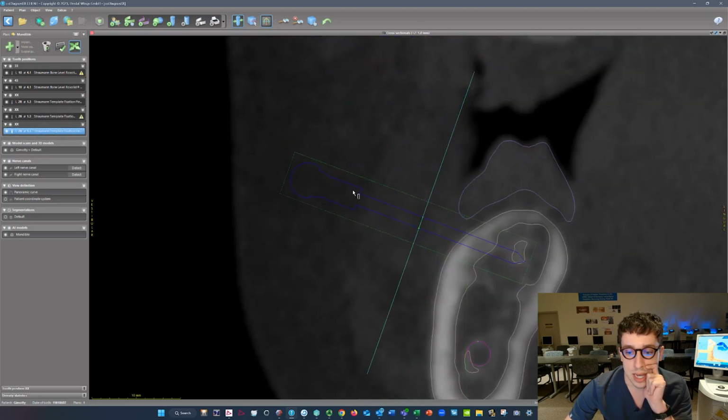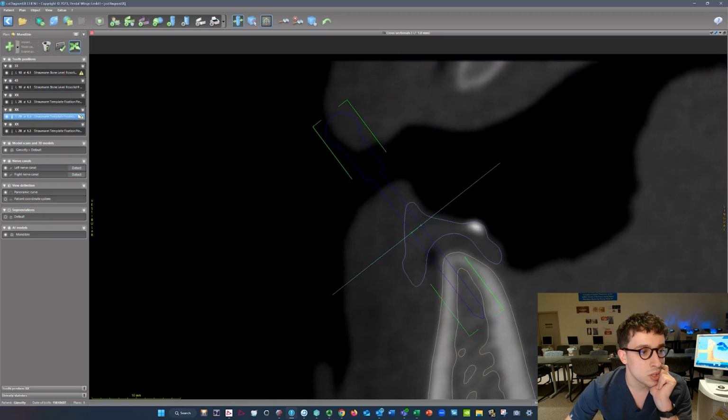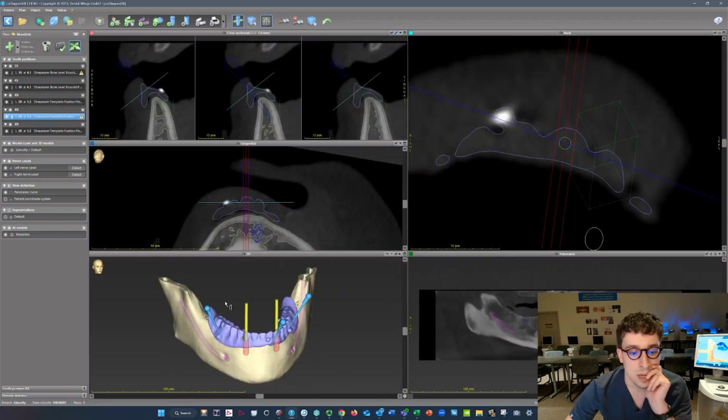And you can see the IA on this one. We are going to move this around a little bit, but we just want to make sure that we get it fairly close for this, which looks good. So we are a little too close. You can see the error on the left side. Our fixation pin is too close to this implant, which probably makes sense because we can only see it in one direction. Yeah, that is kind of just right there.